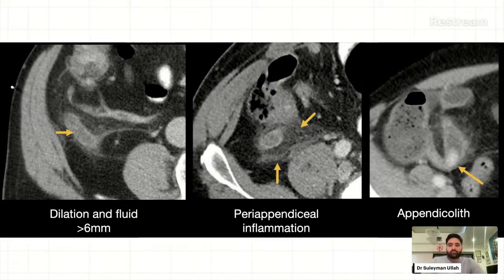Okay, so I've not got an actual single picture of an appendicitis case. I've got three different ones where it's all combined and it shows everything clearly. So appendicitis, we used to traditionally see this in one age group, and that was a young, 15 to 25-year-old age group. However, now we see that there's two peaks of appendicitis. We have it at that 15 to 25 age group, and then also later on in life, we see it in older adults as well.